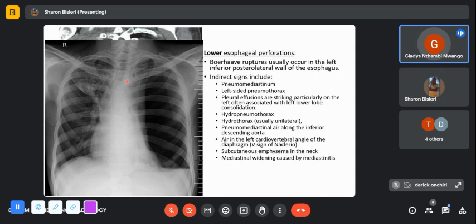That was a good pick. Yeah, there's quite a bit of significant rotation here, and I agree. This is a PA, not an AP. It's a PA because the scapulae are actually away, and the heart is not enlarged. Though I must admit, there's an air-fluid level, and that can also be a sitting-up AP, but I think it's a PA. So, how do you tell the significance of the shift?